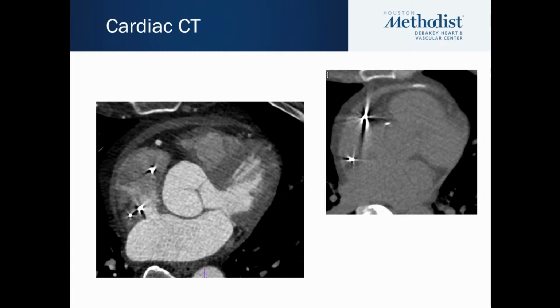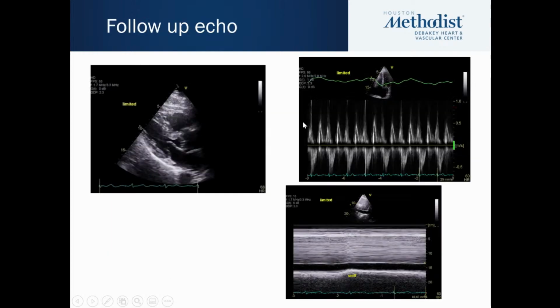He gets a cardiac CT. I can't remember why exactly, but the key finding here is that he actually has an ASD, and that could manifest or adjust your filling pressure interactions, similar to pulsus paradoxus, where you may not necessarily have all the features. And notice he has the pericardial hematoma, essentially, anterior to the RV with a minor calcification as well. On a follow-up, he still has the septal shift, no major variation across the mitral valve. He has the dilated IVC.